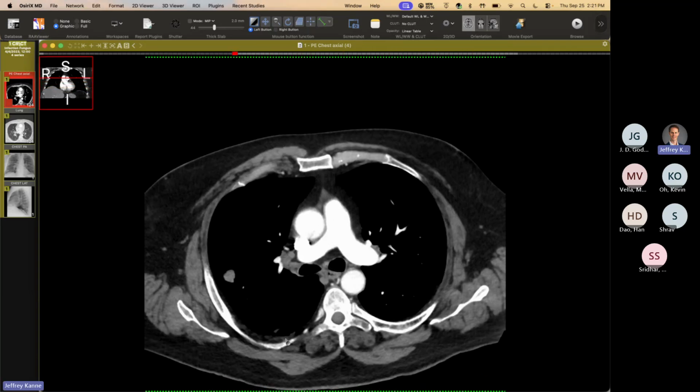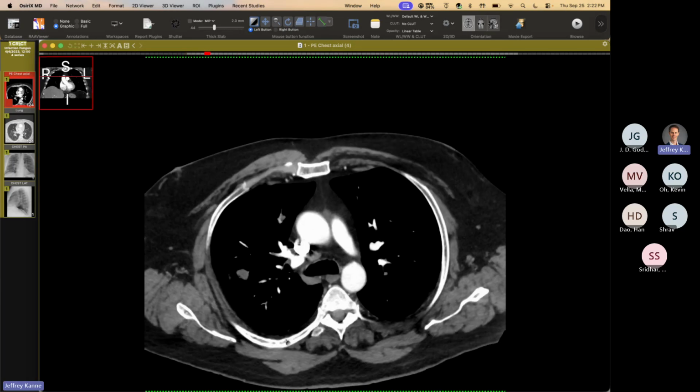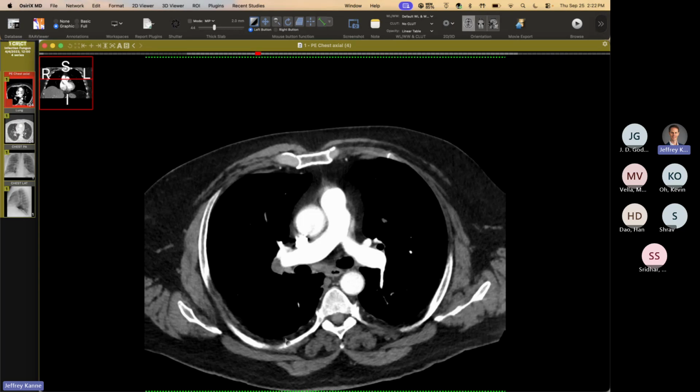So he's immunocompetent. So we would think about things like, at least fungus in particular, around here, histo and blasto. Blasto usually presents as more mass-like consolidation. It's cavitary. Histo is usually clinically silent, or if it's more severe, it's tiny little nodules. But he underwent a bronchoscopy, BAL, transbronchial biopsy, and this is blastomycosis, which is unusual.